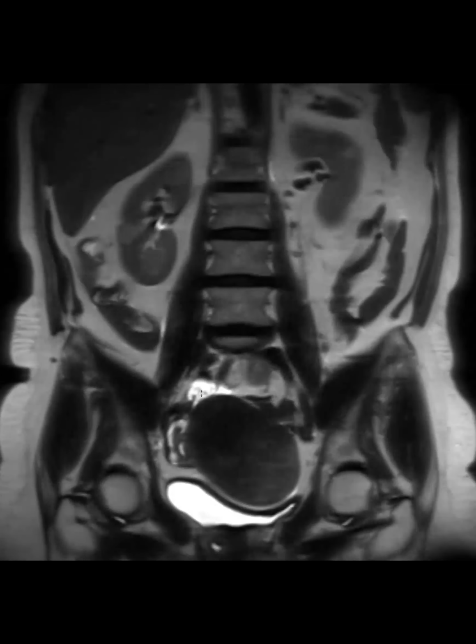And then we see the same thing on our case, but it's just more of an MR variant, the modality is just different, but it's the same thing. It's a lymphangioma along the course of the right gonadal vein. You can see it going into the right ovary right there. So it's just really cool.